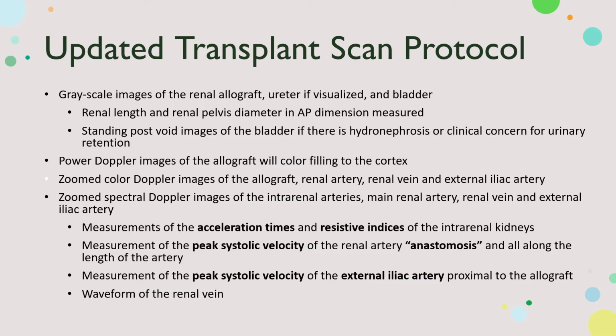In addition to that, we're also going to add power Doppler images. So we have been a little lax with what we're accepting as far as our color pictures, our color perfusion, how well is the kidney perfusing on color Doppler. We're going to start doing power Doppler images, and I've instructed them to make sure that they're decreasing the scale and increasing the gain to make sure that we can really visualize flow out to the cortex.